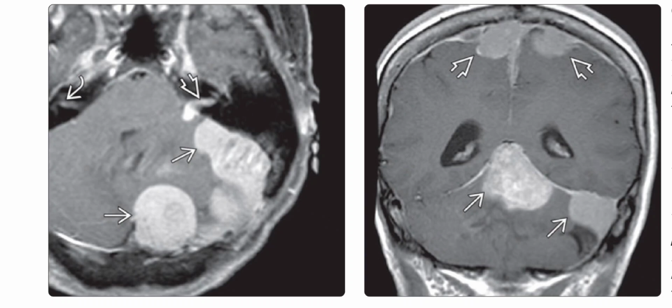The right image is the coronal T1 contrast-enhanced MRI, and it shows the dural-based meningiomas in the posterior fossa and along the falx and convexities. In this patient, the meningiomatosis predominates over the schwannomas.